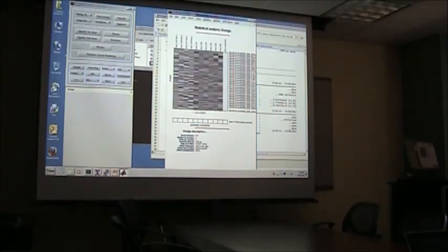See what the higher values are, and dark should be low ones, yeah. So this looks a little different from the models I presented in my first couple of slides, but it's essentially the same thing, right?